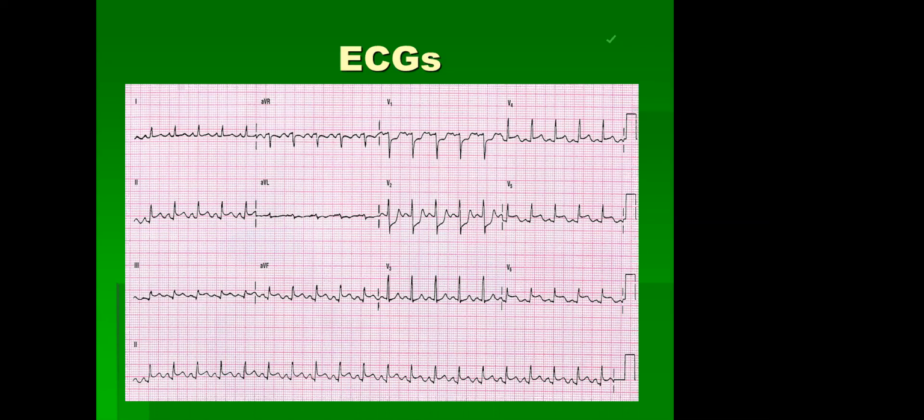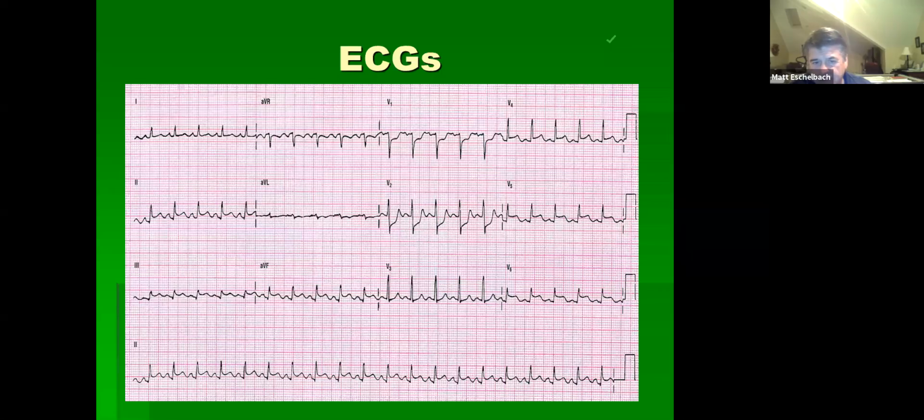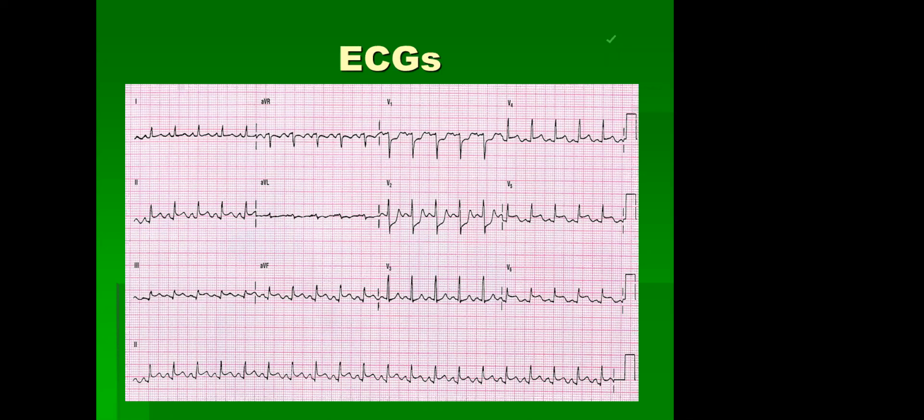I think I see some slight ST elevation in 2, 3, and AVF. Okay, so do I. Now, lastly, let's go to our anterior and septal leads. V1, V2, some ST depression. And then V3 looks pretty normal, and V4 actually has some ST elevation as well, right there.